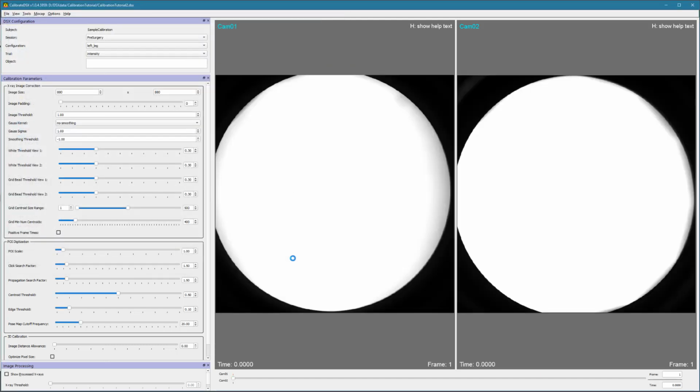The white images in this dataset are not ideal, but they still provide some benefit in non-uniformity correction. Ideally, no pixels of the images should be saturated at maximum intensity, as many in these images are. The purpose of white images is to show local variations in intensity that occur not only around the edges of the viewing circle, but also in the interior. Gray image might be a better term, as we recommend that the average intensity across the image be about 75% of maximum. It is not a problem if portions of a white image are dimmer than portions of an image being corrected.